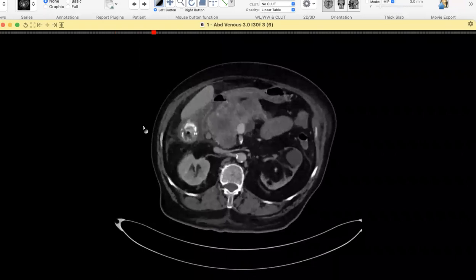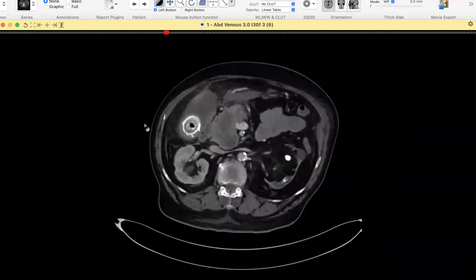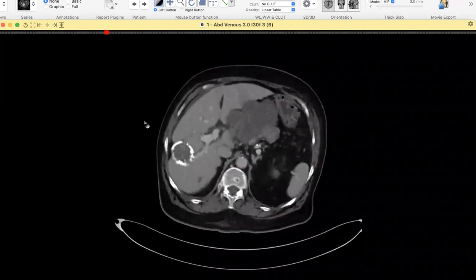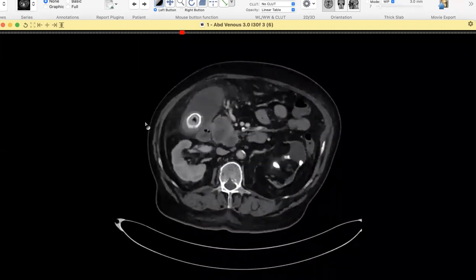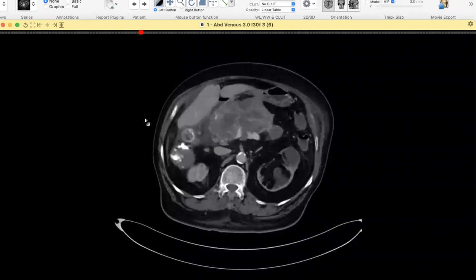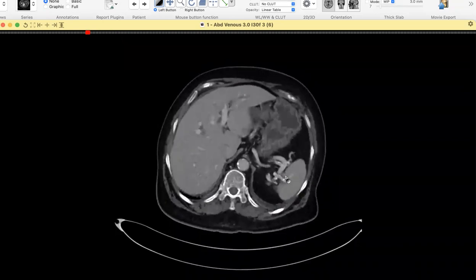Right hypochondrial pain. They're not really concerned about pancreatitis because clinically there's no epigastric pain radiating to the back. But I can see the pancreas here is hugely enlarged. So it could be an incidental lesion, but can you tell me the differential for this?